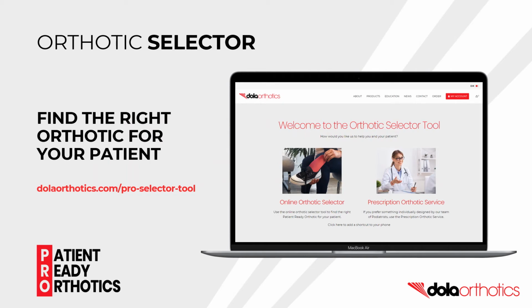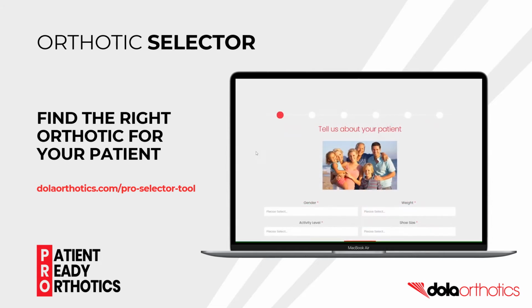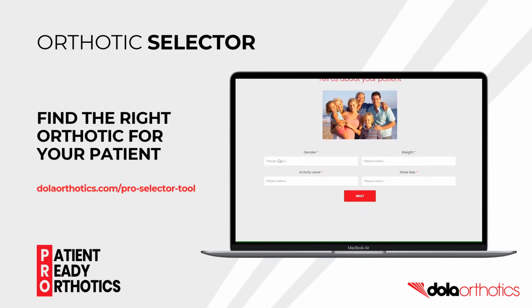Access the online selector tool through our website or at the following link, and select Online Orthotic Selector from the menu. Then tell us about your patient, starting with gender, body weight, activity level, and shoe size. In this example, we have selected a male, 60 to 80 kilos, who is moderately active, wearing a US men's size 10 shoe.